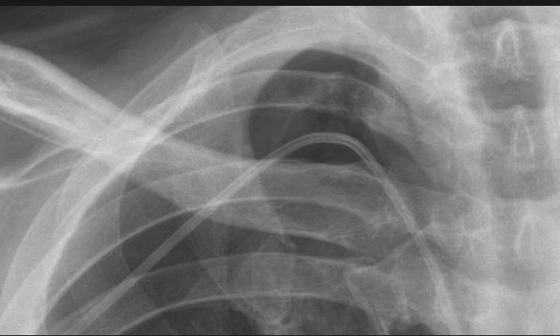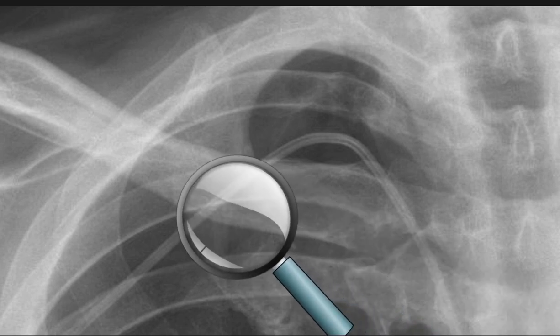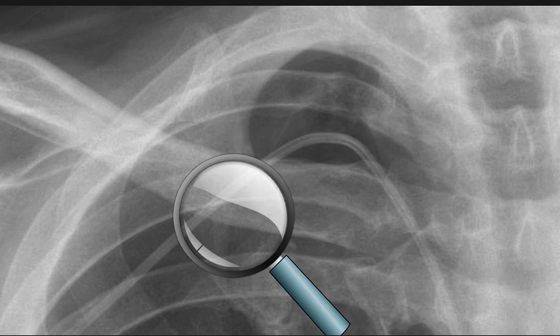The other hard rule, remember, is that we want this thing to be shaped like the chest, right? Not running off the side of the chest out in no man's land. If that is the pleural line, it should be in the thoracic cavity, and that's where it has to stay. The soft rule that we discussed before was a void of vascular markings in the more lucent portion. So let's zoom up here and see if we can see that pleural line a little bit better, and maybe if we see less vascular markings.